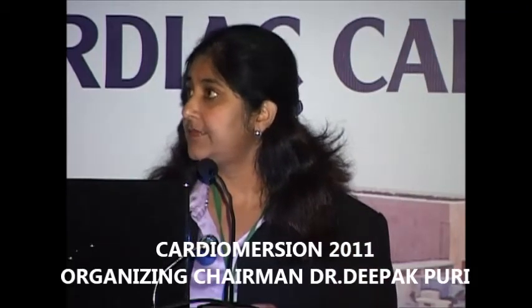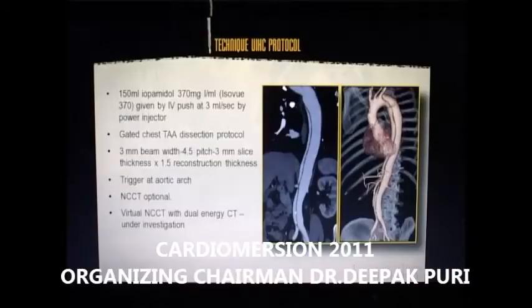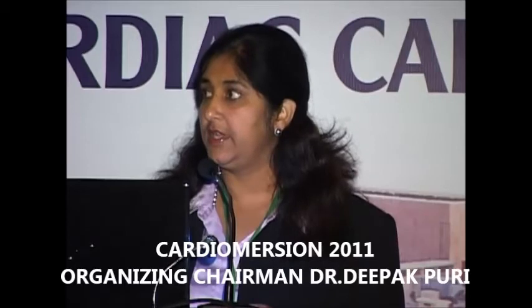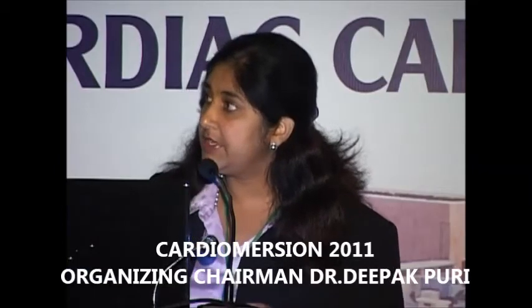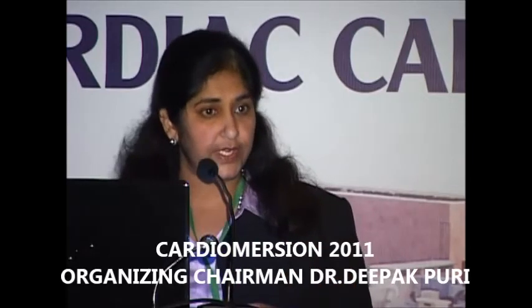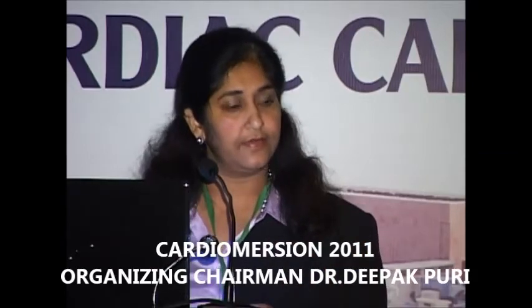I will not emphasize much on the technique in this scenario, but if anybody wants to ask me questions about that, I will be happy to answer. The only thing I will emphasize is that the reconstruction of the aorta is very important. What we rely on a lot when making a diagnosis is the left anterior oblique sagittal reconstruction, which gives us this candy cane aorta appearance, which is very helpful not only for the radiologist, but for the cardiothoracic surgeon, who can visualize things from his own perspective.